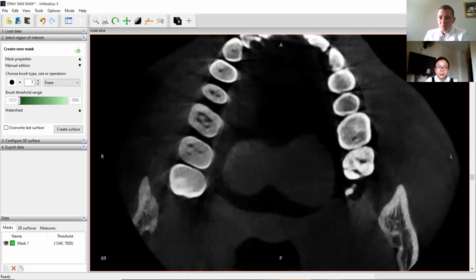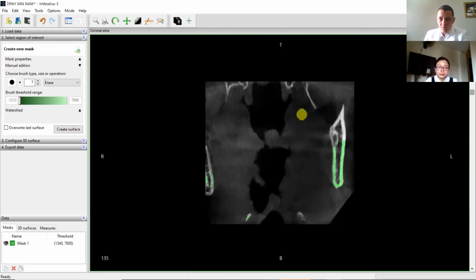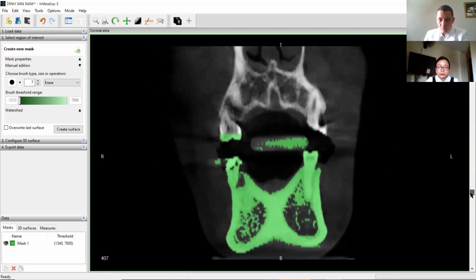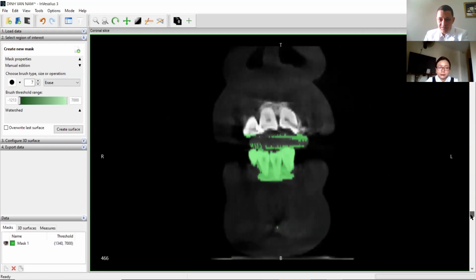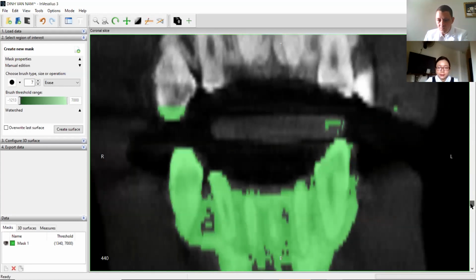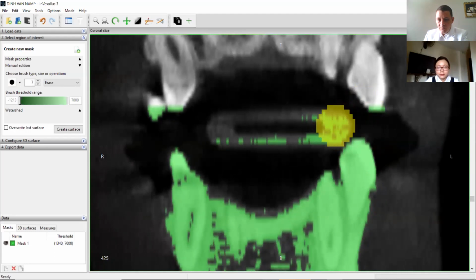Okay, so for this view it's okay. On the coronal slice. Thì ở cái phần lát cắt đứng dọc thì mình sẽ kiểm tra nó xem có cái gì chạm nhau giữa hàm trên và hàm dưới không. Okay, here you see we will have a trouble, yes, with this part. Thì mình sẽ thấy rằng là mình có vấn đề này ở chỗ cái thanh cắn. Okay, so it will touch here.